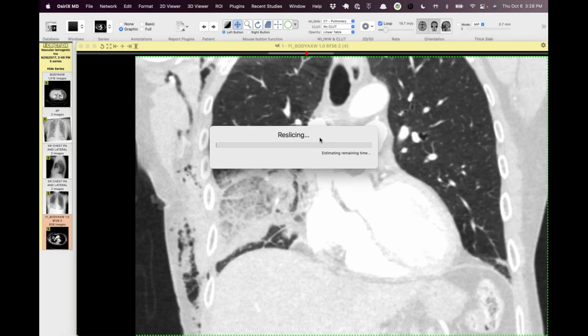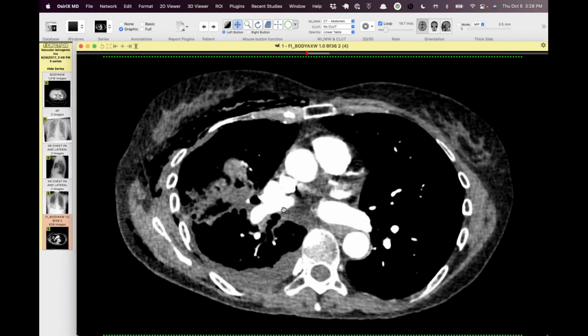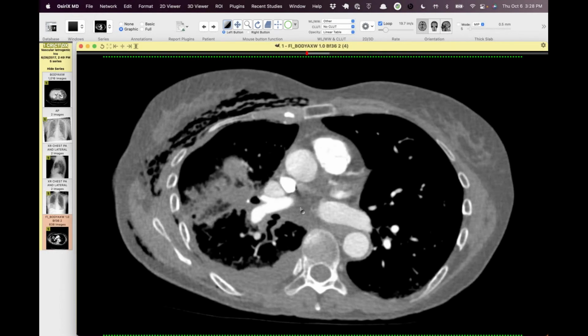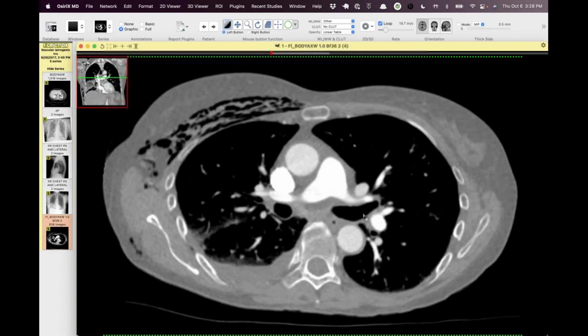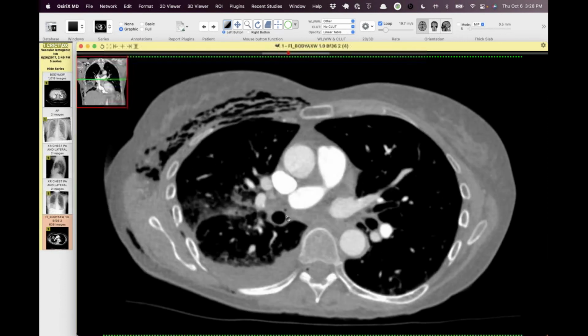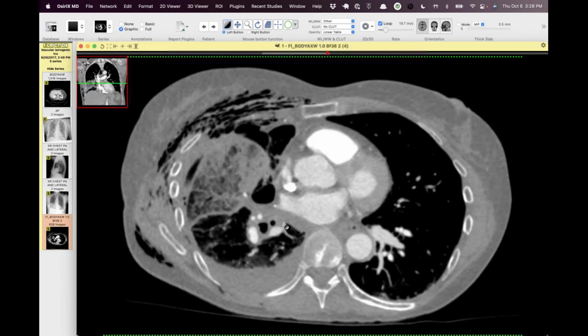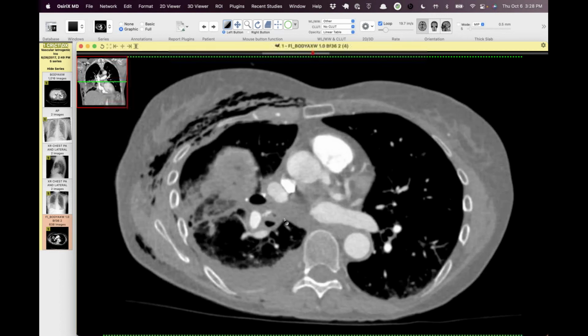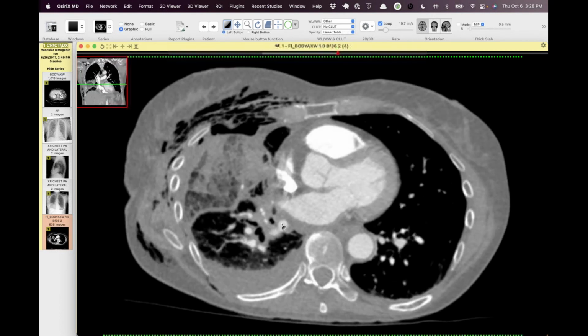So do you think the remnant torsed? No, I think they ligated the entirety of the vascular supply to the right middle lobe, but they only ended up taking out part of it. Let me show you on the axial, because that's what we were trying to look at. Let's see what the best window is to look at this.